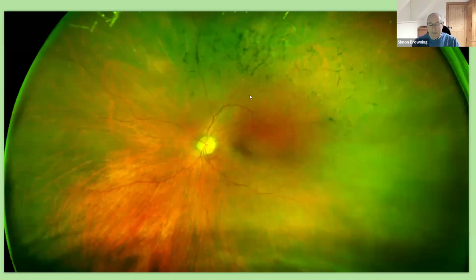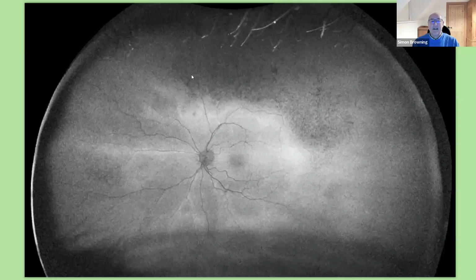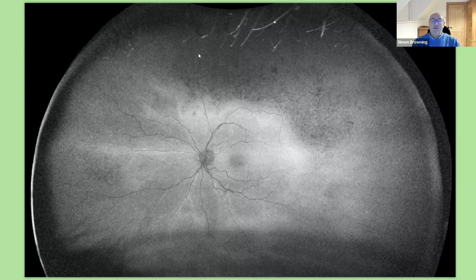Here's a retinitis pigmentosa. And with the retinitis pigmentosa, as I say, you see this whole area where it's hypofluorescent, but with that hyperfluorescent penumbra around there. Now, this hypofluorescent area will very clearly correlate with a visual field image. So again, the hypofluorescence shows you the area that is non-functional. That will very much correlate with your visual field results as well.